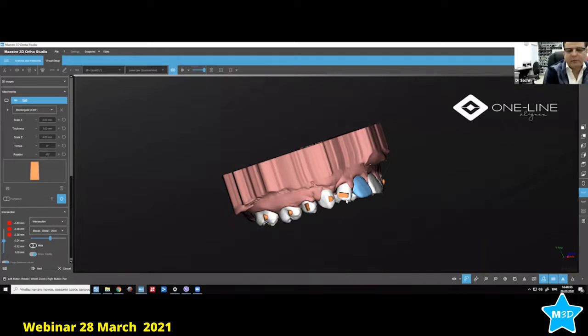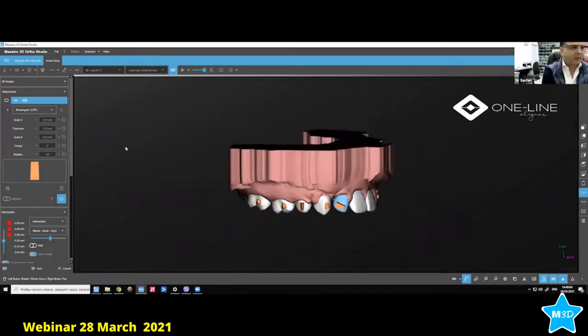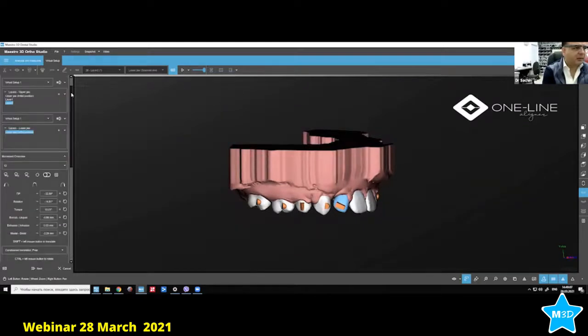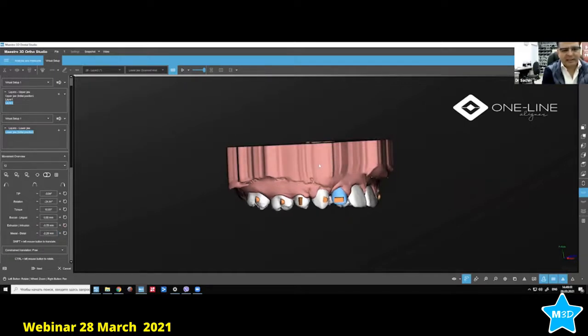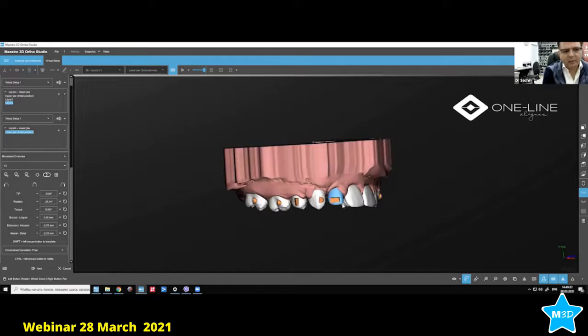You would like to keep the crown here. So here, if I make that movement, this I will not move if I want to move the tooth distally. So what I will do is I will remember the place for the mesial distal, minus 2.29. I will keep it here. I will make a distal movement and I will keep this place here, you see? Yes. I don't want to move the crown mesial then. I hope that makes sense. You have to make two movements together if they are in the same direction. If they go in different directions, you cannot do that. Then it will not work.